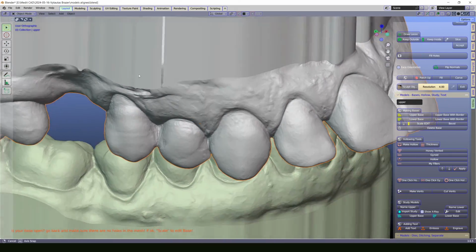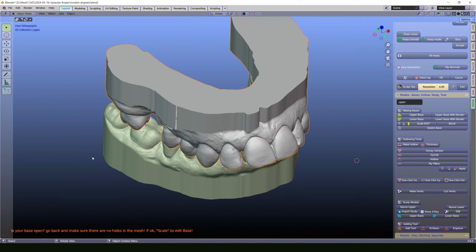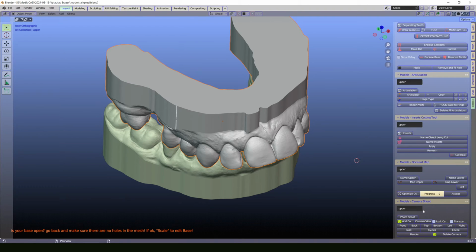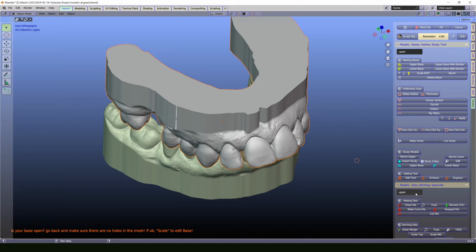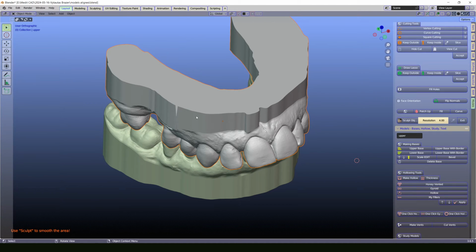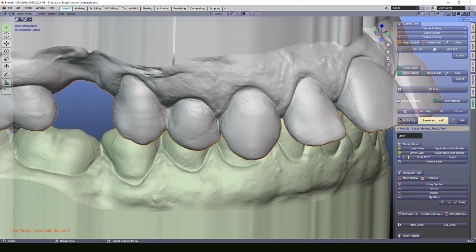Oh, actually we have. I need to check here. Let's see if I can close that hole. Nope. I will need to fix it.